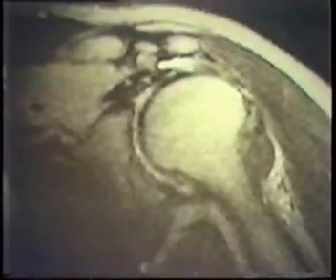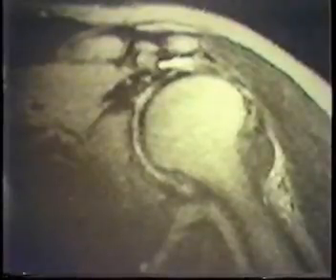And that's why I think the second echo is helpful. I find the second echo to be helpful rarely in this disease, but when it is, it's very helpful. Most of the time, I just look at the first echo. If we're looking at impingement, or at higher signal intensity for partial tears or tendonitis, the first echo, or even a T1 weighted image, would be the best.